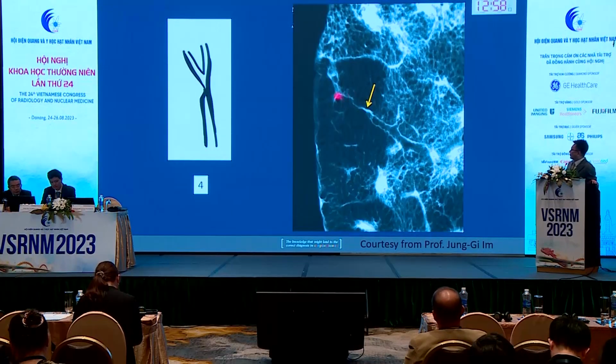And the last one is the bronchial stricture. This is the radiograph of the histology. You can see complete obstruction of the bronchiole, and the surrounding lung becomes hypoattenuated because of the air retention. So this is permanent damage. Even though the disease is completely treated, this permanent damage will remain with the patient until the last day of their life.